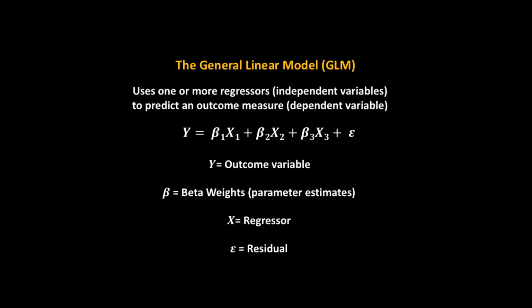Let's say that time course at a single voxel. So don't think about the whole brain, just think about a single voxel. Within that voxel, we have our regressors specified by, say, x1, x2, x3, if we had 3 regressors. And remember I talked about scaling the amplitude of each of them. That is this beta, also called a beta weight. So how much do I need to scale each of those? And is that amount I need to scale it significant? Those are the main questions we ask during the fMRI analysis.